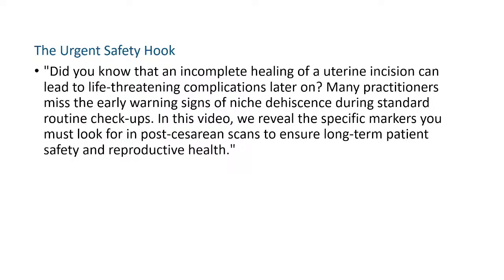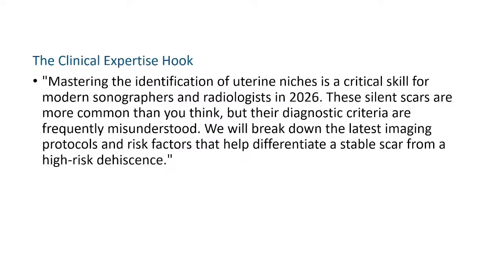In this presentation, we reveal the specific markers you must look for in post-cesarean scans to ensure long-term patient safety and reproductive health. Ladies and gentlemen, let me ask, do you check for these? You see how critical the history of a patient matters in medical ultrasound imaging.